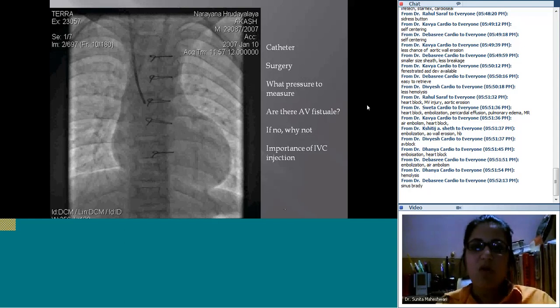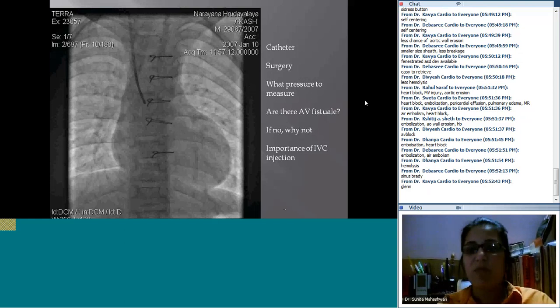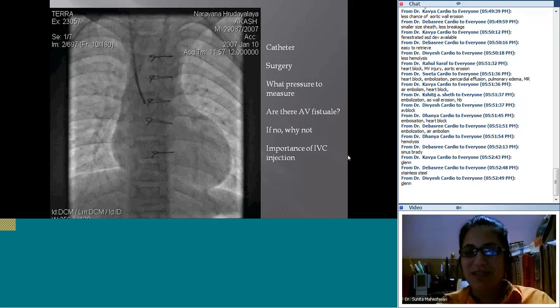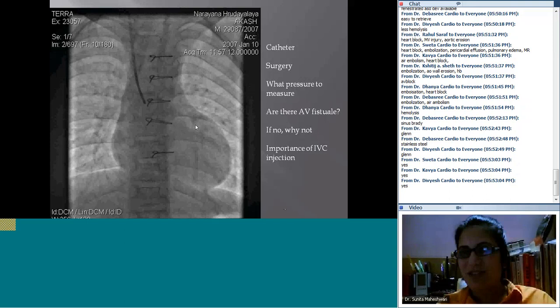Okay, so what are these? Stainless steel. These wires are made of stainless steel. Can you go through a metal detector with these wires? Are you going to ping? Patients will ask you this, can I go through? And the answer is you can go through. They actually don't set off the alarm. I guess they're very small and not significant enough to. So they're made of stainless steel.